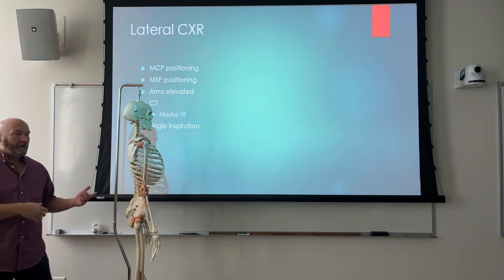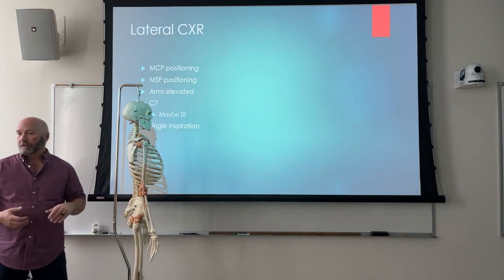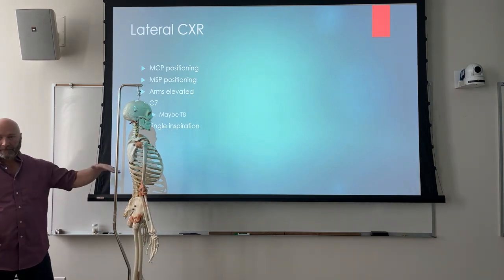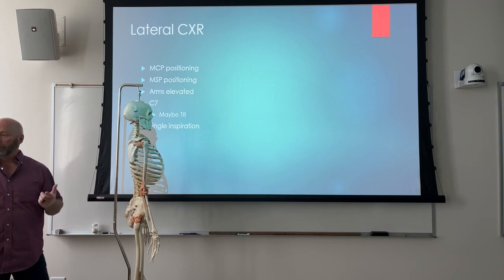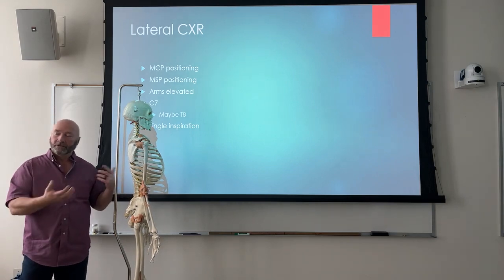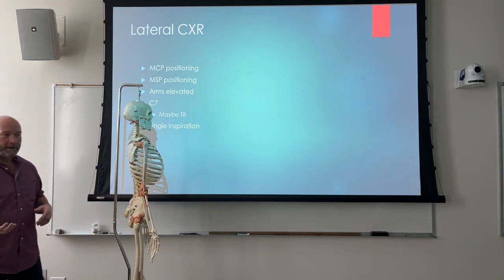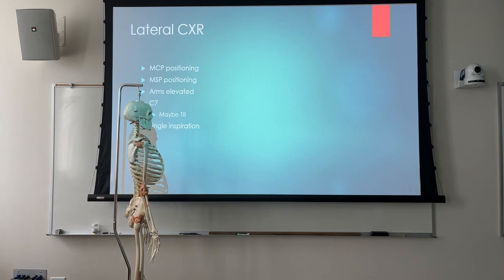So then again, back to our lateral chest X-ray on this patient, his arm had not been used in a long time. That particular arm over the lung field on lateral chest X-ray, you couldn't hardly see it. It was like soft tissue. So soft tissue still casts an artifact, but it wasn't as bad as you would probably immediately think it was going to be. It was mainly gone. So get the arms up, if at all possible.